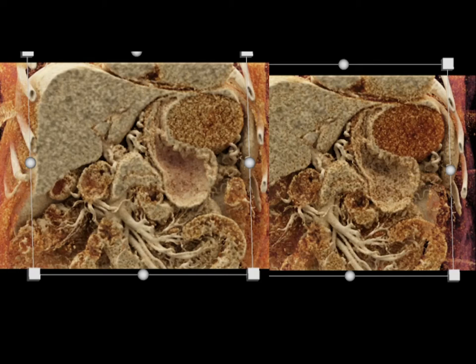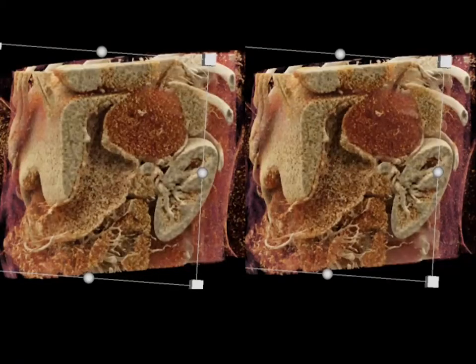Here it is on the cinematic rendering. I've also seen diverticulum off the posterior gastric wall be called adrenal lesions. I've also seen just the stomach collapse be called an adrenal lesion. So you need to be careful, particularly if you only have a chest CT and you only have part of the abdomen, and you tend to overcall things in that regard. Here's a nice example from the sagittal view showing you the GIST tumor, typical exophytic lesion, simulating, but easy to diagnose as not an adrenal lesion.